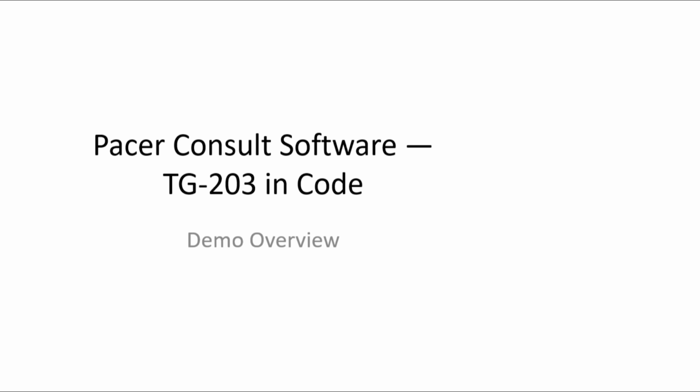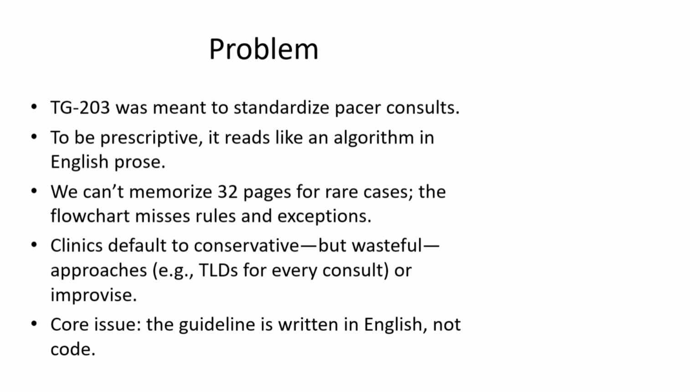So the following is a demo of Pacer Consult software, which is really TG-203 in code. So what is the problem being solved here? TG-203 was meant to standardize Pacer consults.